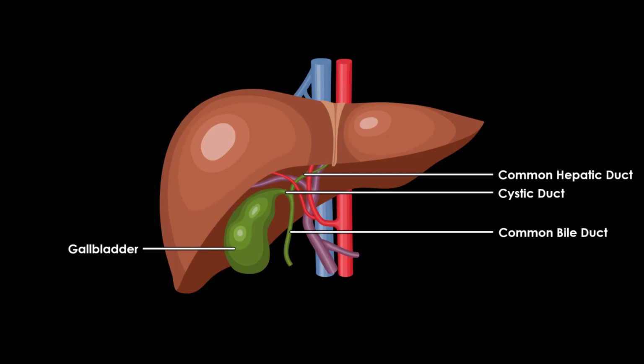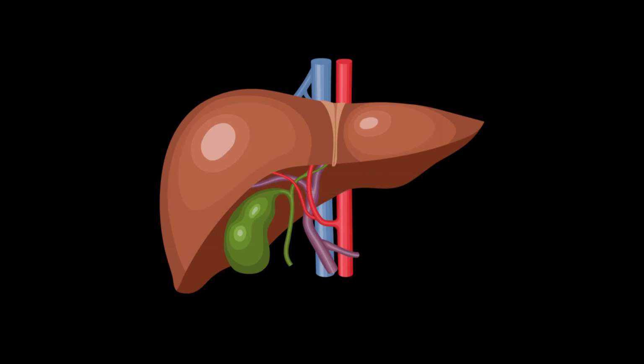This illustration also shows us the unique vascular system of the liver. The liver has a dual blood supply. It receives venous blood from the portal vein, which itself receives blood from the superior mesenteric vein, the inferior mesenteric vein, and the splenic vein. The portal vein brings nutrients absorbed from the intestines into the liver, where the cells process the nutrients. CT imaging of the abdomen is commonly performed during portal venous phase. That is, when the contrast is leaving the gastrointestinal system and arriving at the liver through this portal venous system.